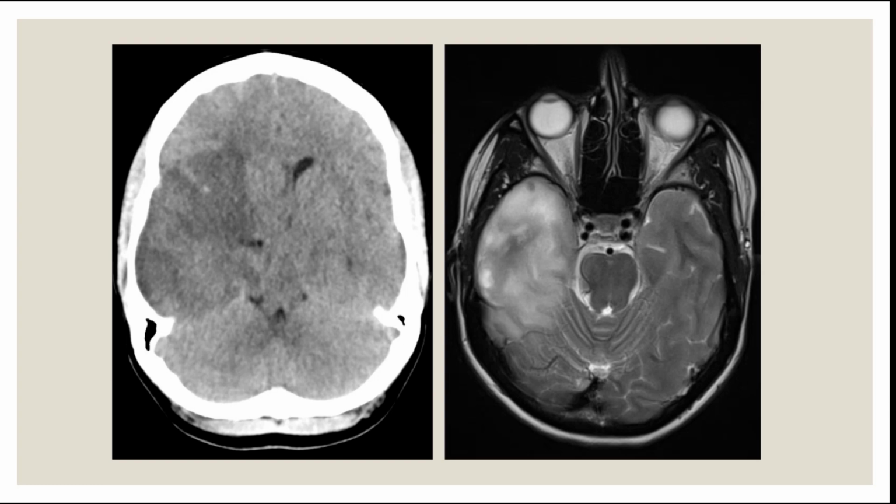So this image, you are right. To the left, we said it's a CT. There is a hypodense lesion, and there is also edema. We don't see the ventricles. Is this a native CT or with contrast?